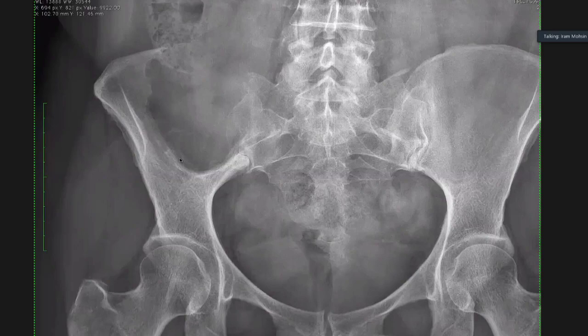Sir, infection doesn't look like an infection to me. The flat planes look nice and clear. So when you talk about bone lesions, you've got a large expansile subarticular lesion. You talked about primary tumor, which is GCT or ABC. What other bone lesions are you aware of?